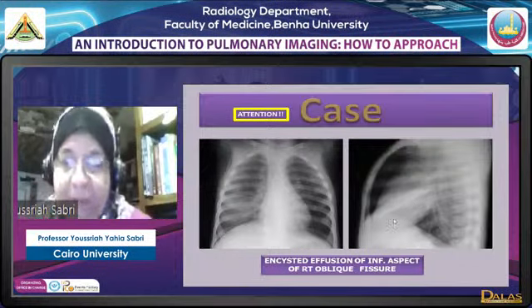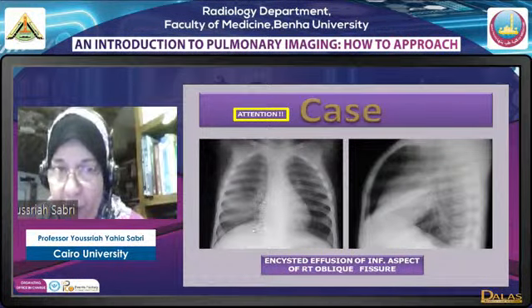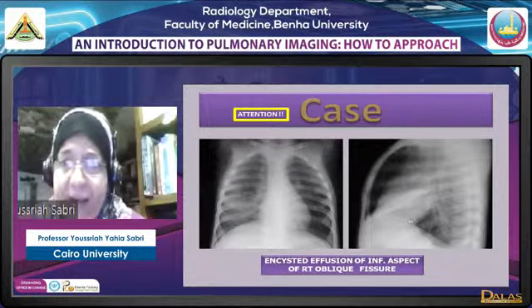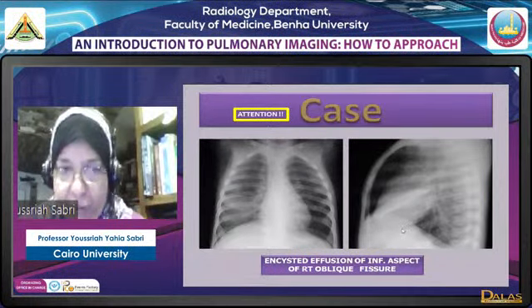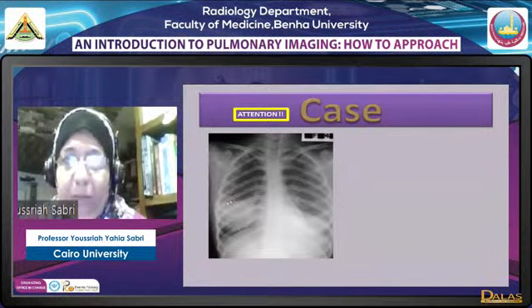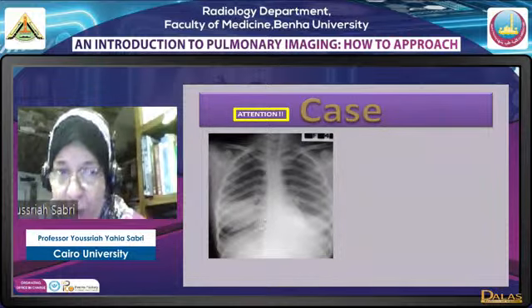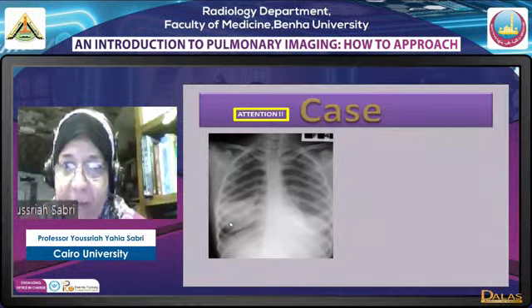So we have the previous lesion, we have a concavity, which means we were dealing with obscuring of the heart, meaning a middle lobe lesion which is collapsed. Here we have no obscuring of the heart border and biconvexity in the lateral, meaning we have a loculated effusion. In this case, we now have obscuring of the cardiac border. We have the linear definition of the opacity, meaning this is the minor fissure here, okay, and this is a basal opacity, obscuring the heart and delineated superiorly by the minor fissure.